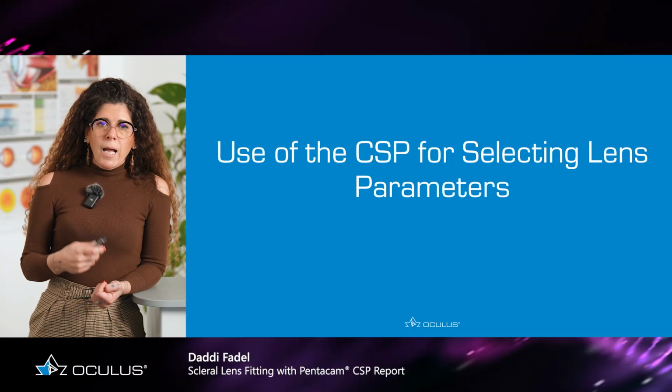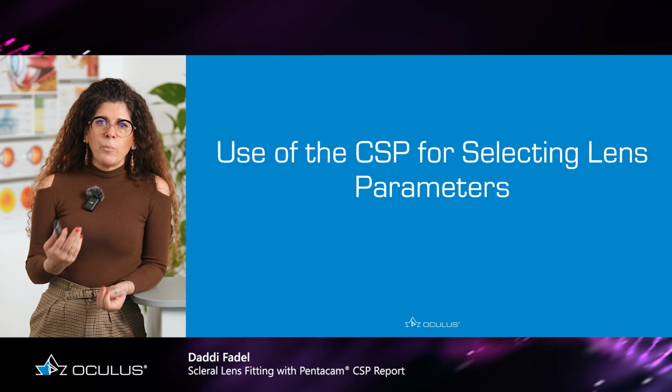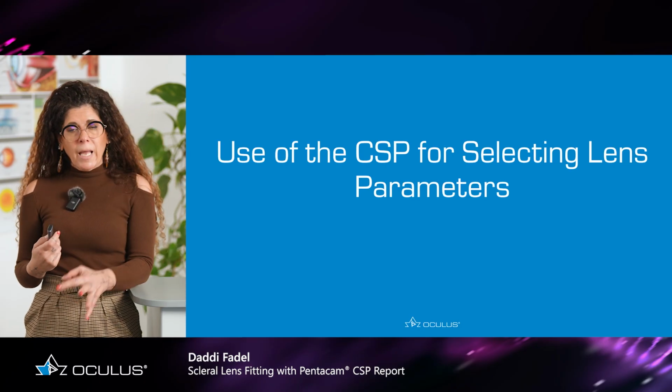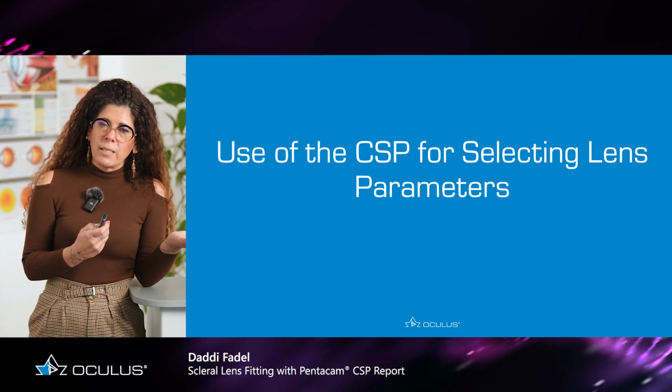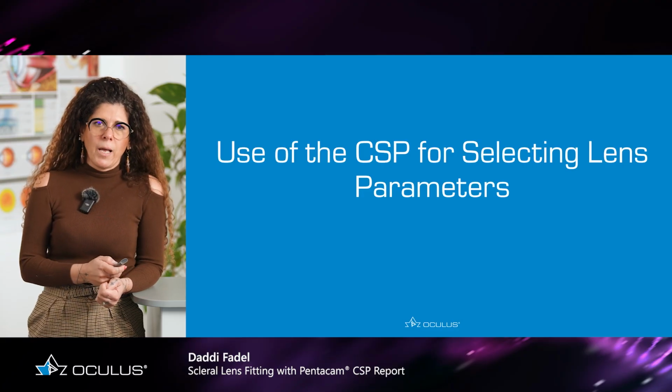Now, understanding how to read the CSP and all the numbers, you can also select the lens parameters without applying any lens on the eye. So you can start by ordering a first diagnostic set and apply that as the first trial set on the eye.